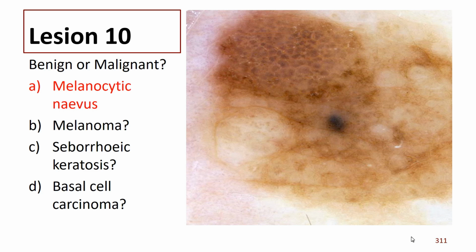It's a combined nevus. Again, you wouldn't even look at this with your dermatoscope because the patient would say, oh, don't worry about my birthmark, it's always looked like that. This one actually was excised on my recommendation because I did think we needed to be rid of it, so we didn't have to monitor it. But it was completely harmless.